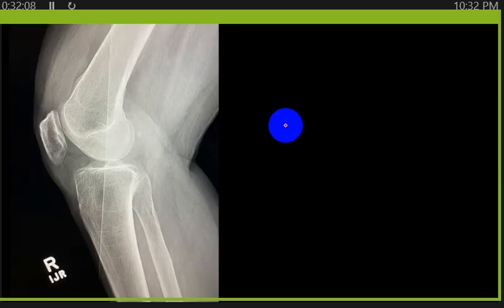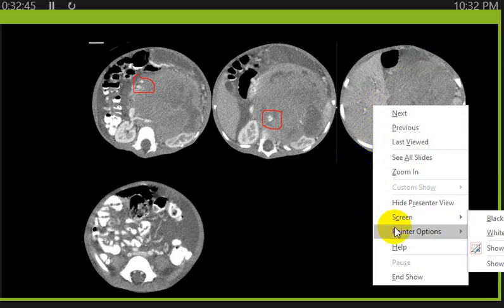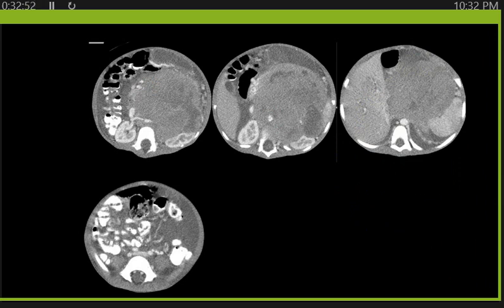Could be this calcification or enhancement here. Floating aorta. This is the aorta, the anatomical position of the aorta. And this one? Mesenteric vessel. Very good. How much is the calcification with the neuroblastoma? 85. More than 80%, it is about 85. Okay, very good.